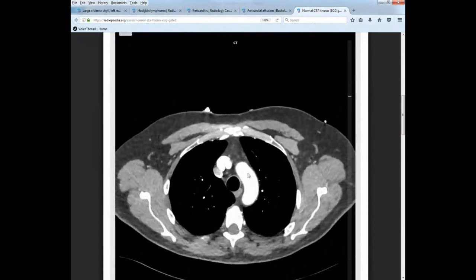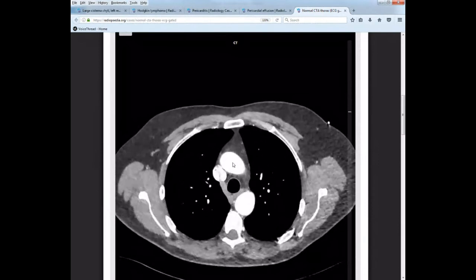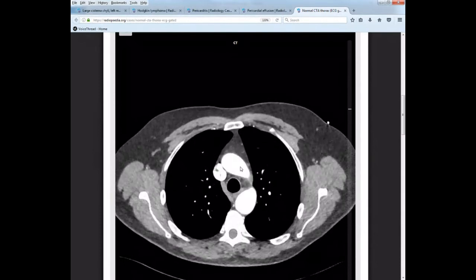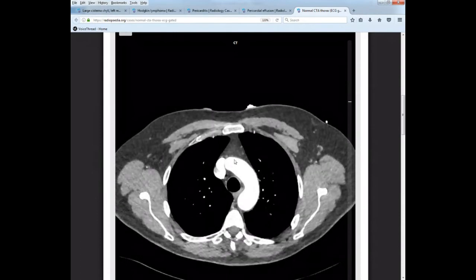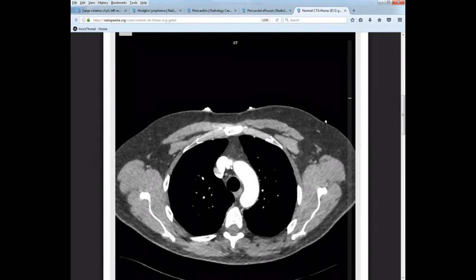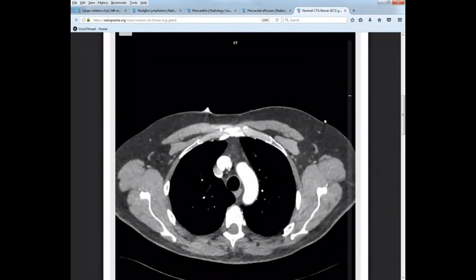Okay, now let's switch over to the aorta. Here's your aorta, ascending, descending, coming up into the arch. Okay, so we're traveling superiorly. The very first branch I'm going to see coming off on the right side, so I'm going to be looking over here, is going to be my brachiocephalic trunk. And here it is right here.